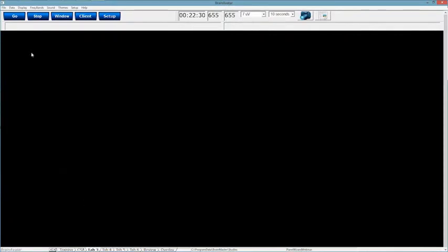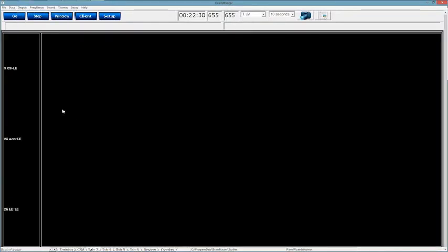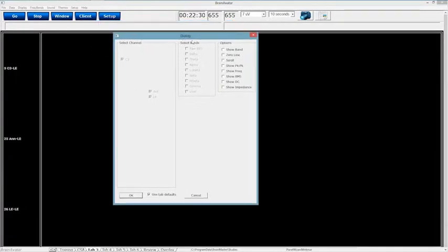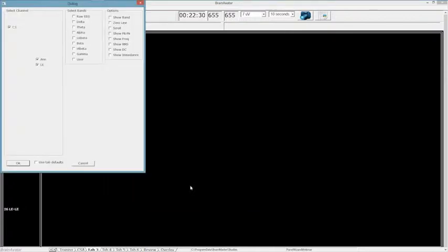What I'm going to do is I'm going to go to tab 3. I'm going to go to display, and for example, I'm going to go to my display right here called acquired waveforms. What the panel menu allows you to do, and there's, like I said, one for about 90% of every single display, is to customize more of exactly what you're looking at. For example, in the acquired waveforms, you can actually choose to have different acquired waveforms being displayed or not being displayed. They're still being acquired, but you actually don't have to view them all.